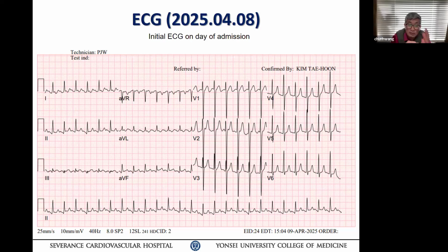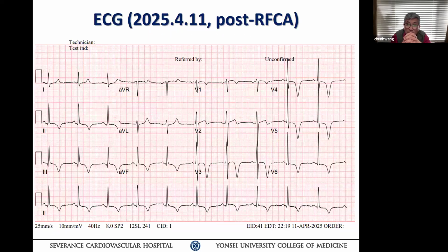So when they implanted the pacemaker, the patient probably had a flutter and it tracked the flutter to operate the pacemaker behavior. I think that may favor that. Now, we still need to explain why the T-wave inversion.